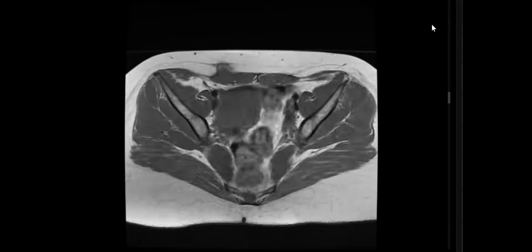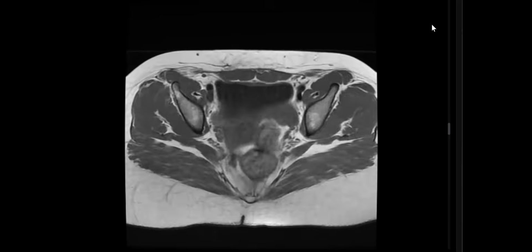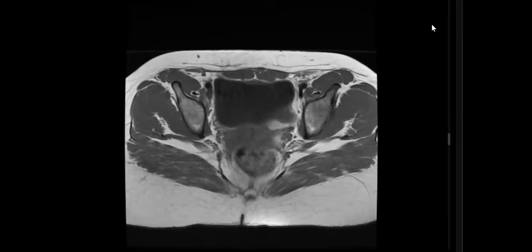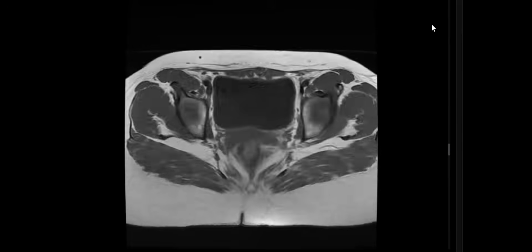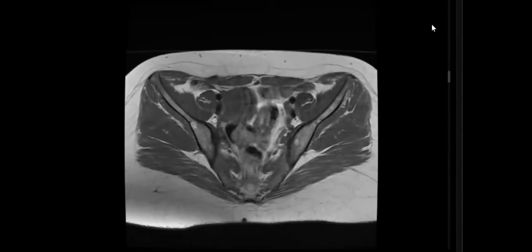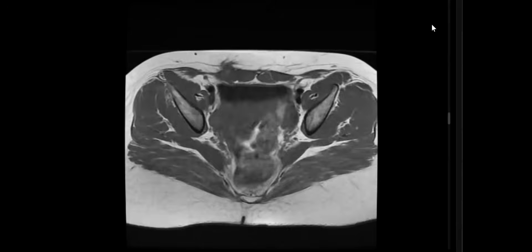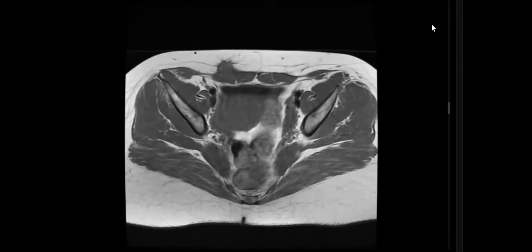I could appreciate some heterogeneous signals anterior to the right rectus muscle that were invaginating into the overlying tissue. Good. Any history you want to ask about in this middle-aged female? Yes, definitely. I'll ask about any previous history of known endometriosis or any previous scar, any cesarean. Any cesarean, not endometriosis. Endometriosis is a diagnosis. Okay. Yes, positive history, and also the type of pain, cyclic pain.